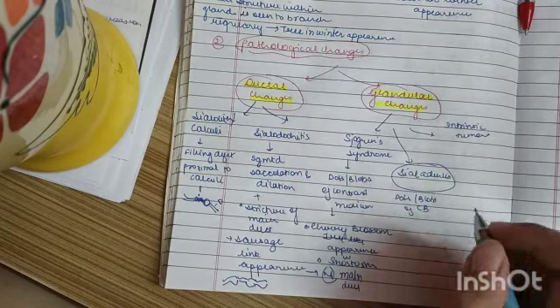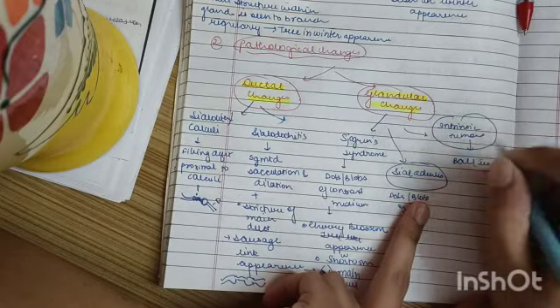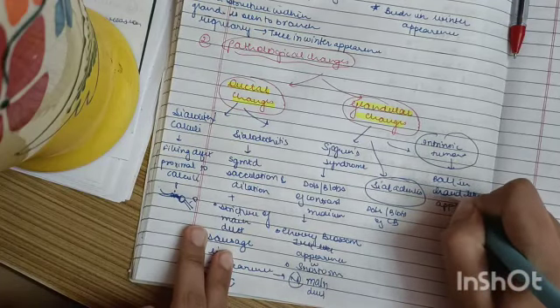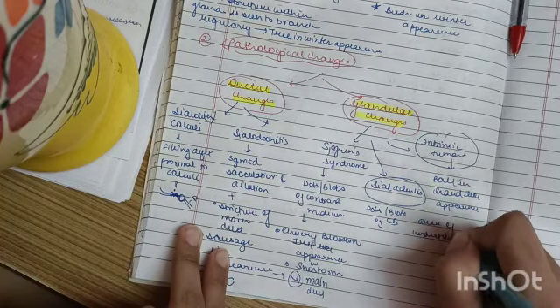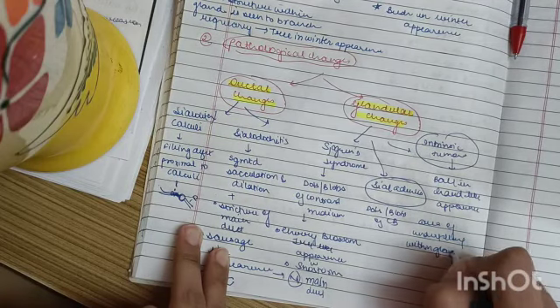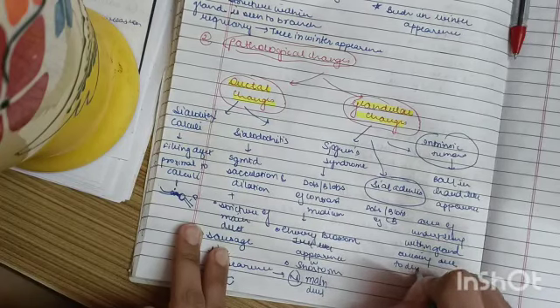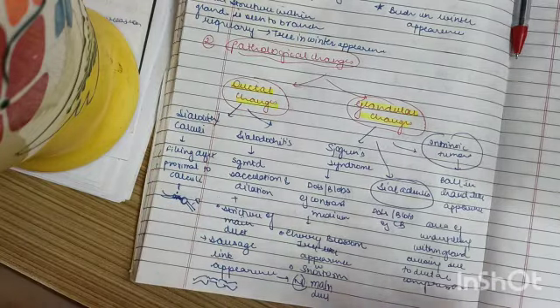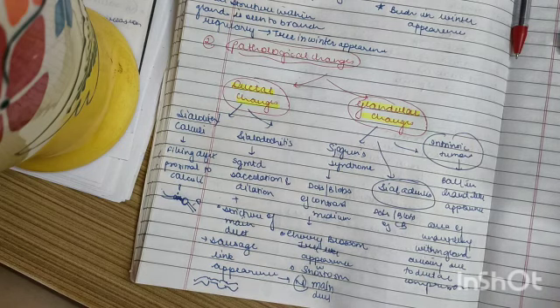Now, intrinsic tumors, very important. They have a ball in hand like appearance. Very important to remember. Ball in hand like appearance. In this, you see an area of underfilling within the gland arising due to ductal compression. One more point to remember in all of these is that there is going to be a retention of the contrast medium due to the obstruction. This is important to remember.